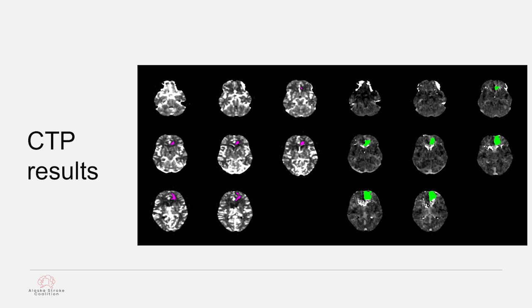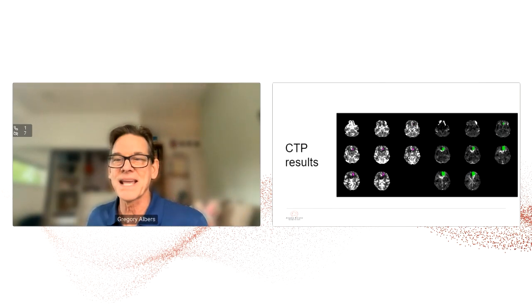An ACA is a vessel that we typically do not do thrombectomy on. There were trials that were released last February showing no benefit from thrombectomy in anterior cerebral artery infarcts, particularly with low NIH stroke scale score. So again, unfortunately, we have now confirmed that she's had a stroke. So we're going to be looking at why she had the stroke and stroke prevention measures, but she's beyond the window for thrombolysis. If she'd come in very early and this was picked up, we could have treated her with thrombolysis. But it's a good example of a stroke chameleon. It looked like a lumbar spine problem, but it was actually a brain problem.